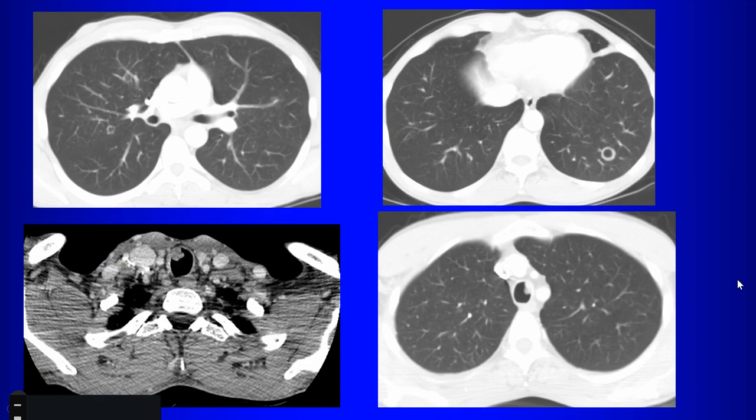How do we put this together? So you have lesions in the airway with thin-walled cystic lesions in the lung. Well, one thought might be, remember we said what kind of tumor gives you cavitary metastases? Squamous cell. So could these be squamous cell metastases? Yes. I was thinking they don't look aggressive enough. They don't have to be, right? I mean, you get all kinds of varieties with that. So it is a thought, but this is a classic appearance of this particular disease. Airway lesions associated with thin-walled cystic lesions in the lung.